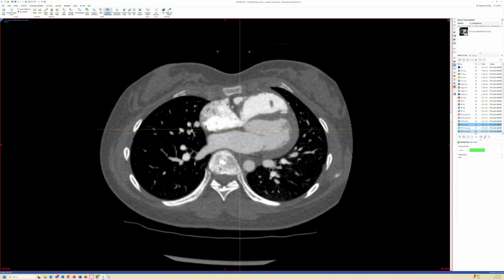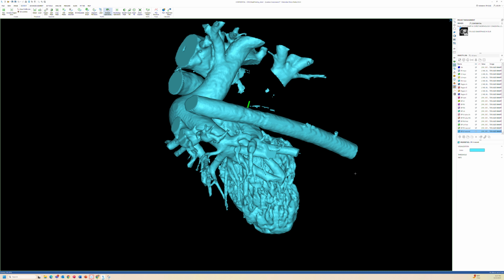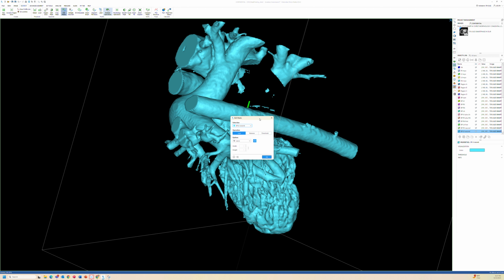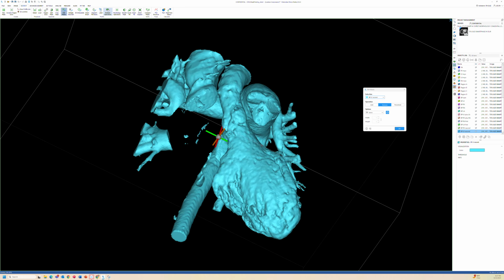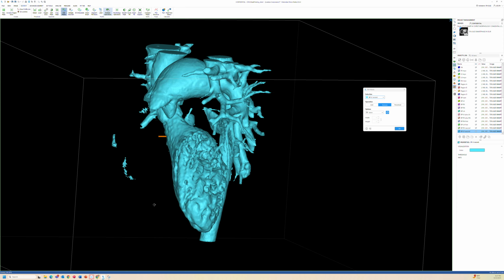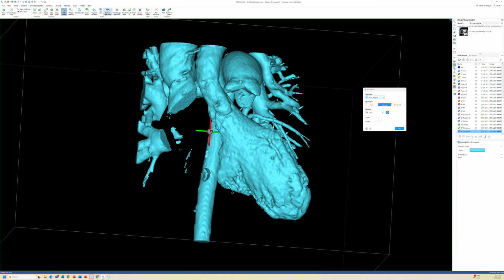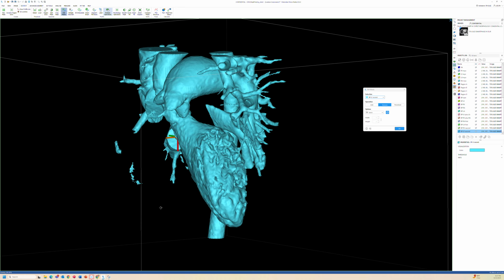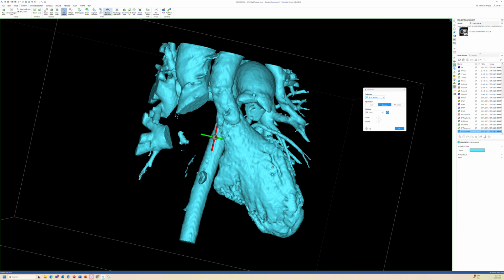Also, I want to show you how I've left a little bit here to show you some of how we perform those cuts. So if I edit mask, all I'm doing here is removing. I took the right ventricle and right atrium that I'd created and subtracted them through a Boolean operation. And then I subtracted that left atrium I just made. So what I'm left with is a lot of this, including you can see the aortic valve coming out.